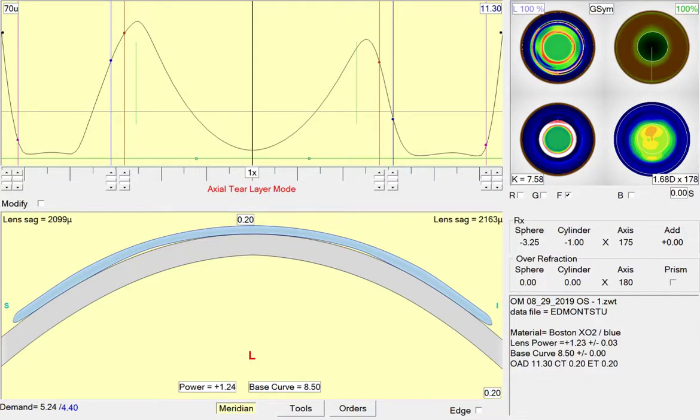In this orthokeratology case, we have a patient who's overcorrected and also has some astigmatism in the post-treatment refraction. The astigmatism is at axis 130, so it doesn't really match the topography and also doesn't match the refraction. I think what I would do is make some adjustments to the base curve first to address the overcorrection and see if that helps with the residual cylinder.